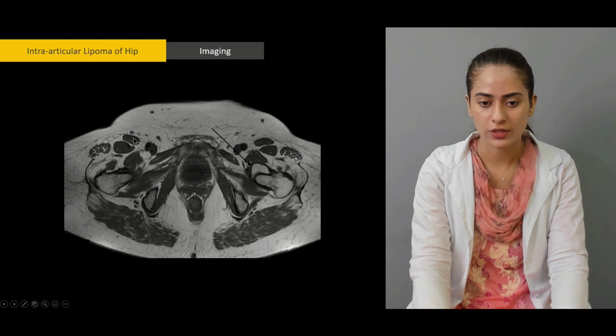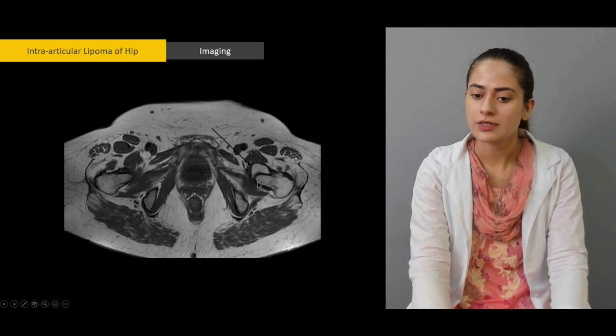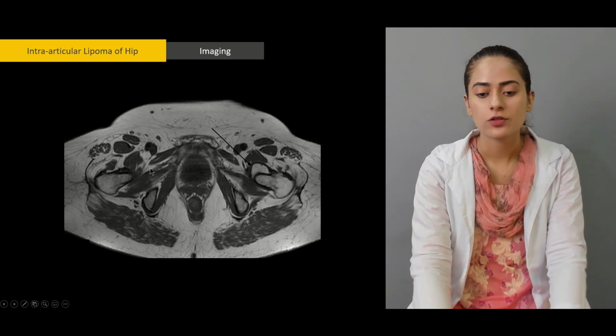This is some muscle or tendon. Okay, these are muscles. These three are present here. So this is also present here. And then bones are the same. But then there is this structure right next to the bone. It's not present here. So that's different, right?